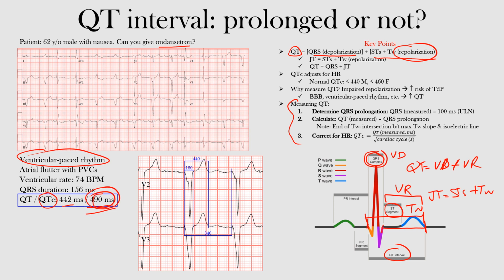And remember that each of those small boxes, this small box here, is 40 milliseconds in duration. That's the width of it. The total from beginning to end would be 200 milliseconds because it's 5 small boxes times 40 milliseconds. So that's how you get that. So how much in this patient? What I've done is take this patient's EKG and blow it up for you. You can take a look at leads V2 and V3 down here.